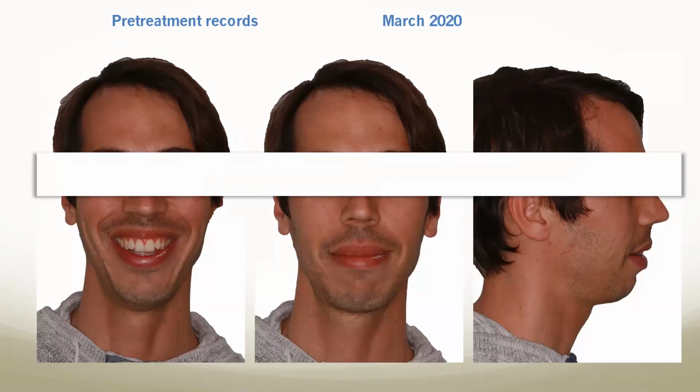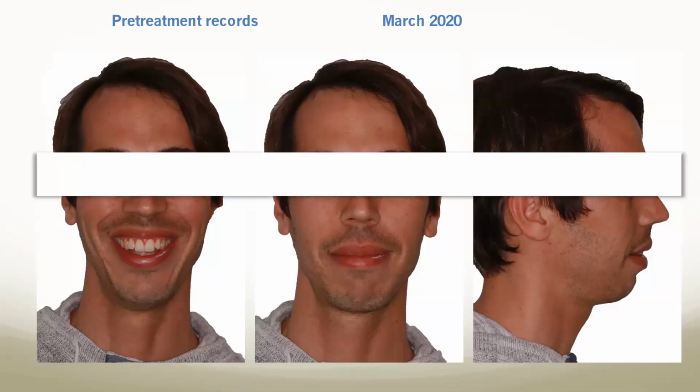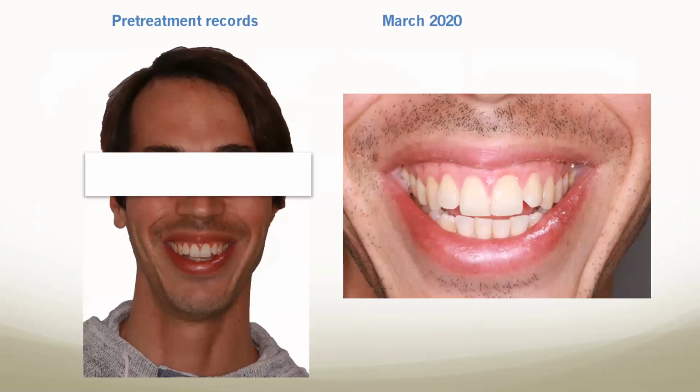This is the patient. For me, the upper midline is centered. And as I can see, and it's my opinion, the lower jaw is a bit deviated to the right. Of course, it's a skeletal class 2. I don't need the cephalometric to see that, it's super clear. You see the smile.